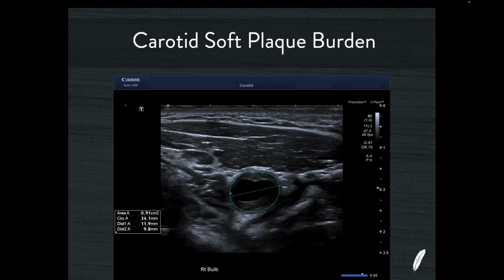I really don't like doing this. This is against my DNA to want to do an area reduction on a carotid plaque like this. But in this case, I didn't feel like I could just sort of pluck a number out of the air. I know this is a significant amount of plaque for a 44-year-old male, and I know it's going to make a difference to the management. So I really wanted to give my radiologist a number to report that was as accurate as I could manage.